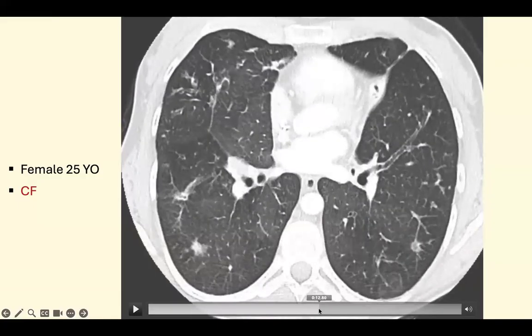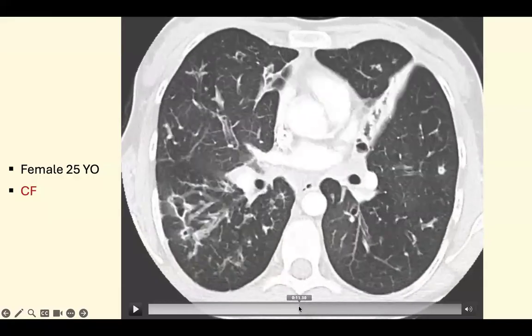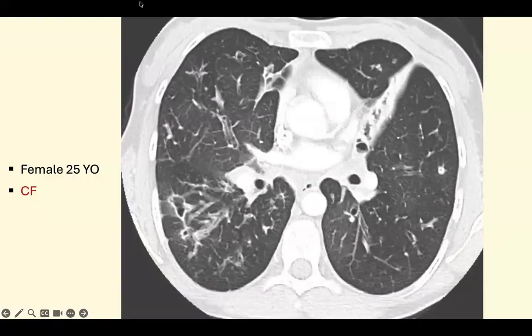Where else can you see mucus plugging? Here, partially thickened. Peribronchial thickening will not be eccentric. So this is partial mucus plugging of this air bronchogram. See, this chronicity causes distortion even in the course and displacement of the bronchi.